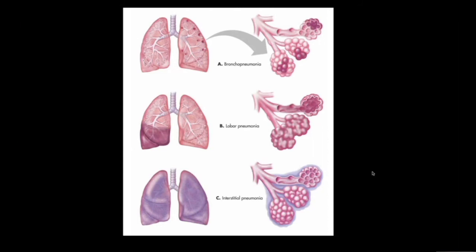influenzae, etc. Lobar pneumonia is when a focal single lobe or multiple lobes are affected in a non-segmental distribution. You tend to see an air bronchogram in the region of the consolidation, and it is mostly caused by pneumococcal infection. Interstitial pneumonia will demonstrate a reticular pattern in a predominantly central distribution.